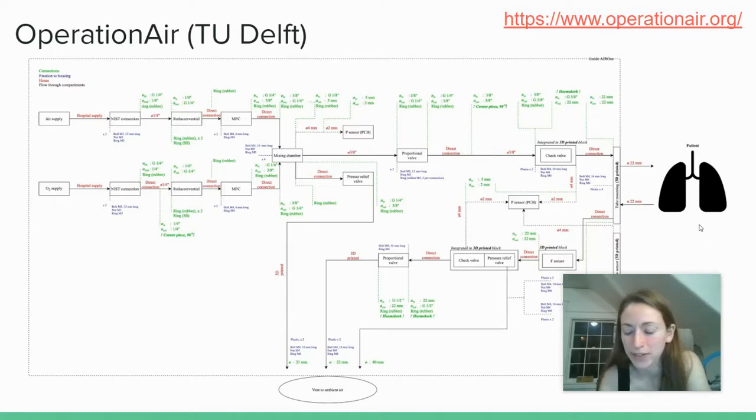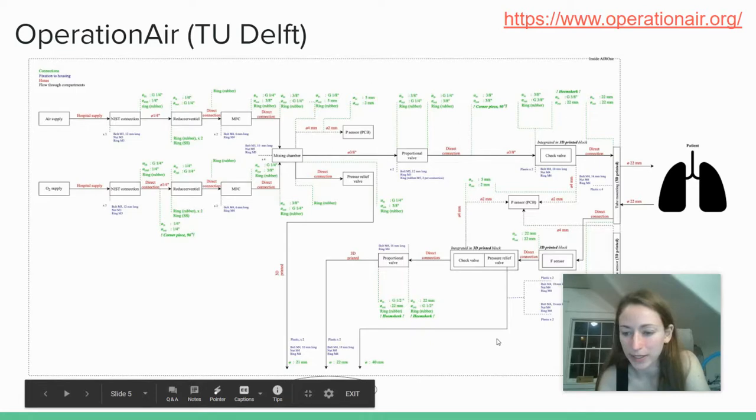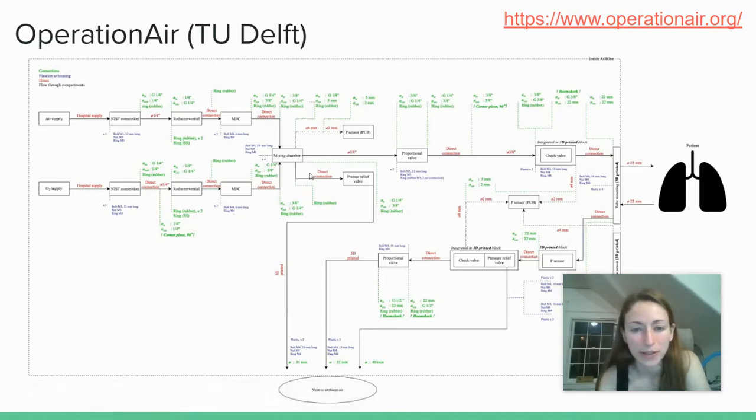Here's where we're going to have the endotracheal tube and the respiratory circuit and everything else. And if we follow the expiratory limb, it looks like it goes down here and it vents to ambient air. Okay, we'll just look at this very quickly. As I've said, we're making the mass flow controller assumption on each limb. We have some pressure takeoff, some safety components like the pressure release valve to ambient.